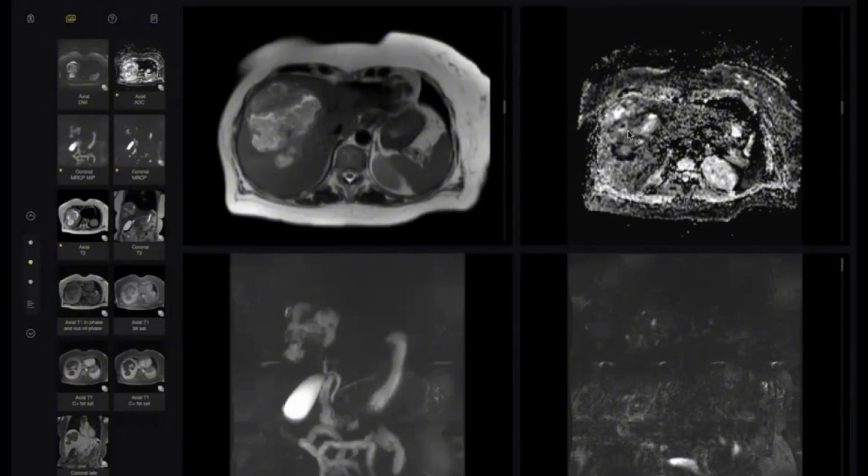What is low ADC? Low ADC values, because there are many values here. We saw it black, but it may be measured. This is not in our scope. So, any proteinaceous material. Doctor, could you describe another material that can show restriction other than abscess?